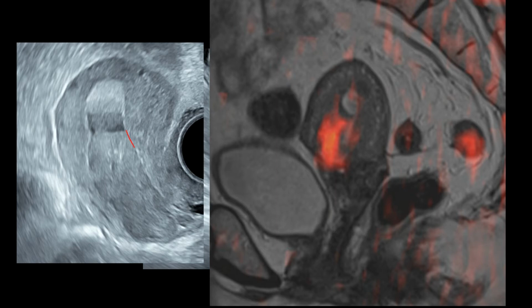The removed tissue is probably this part here. That's why we see the irregular surface of the tumor at the uterine cavity on MRI done after the hysteroscopy.